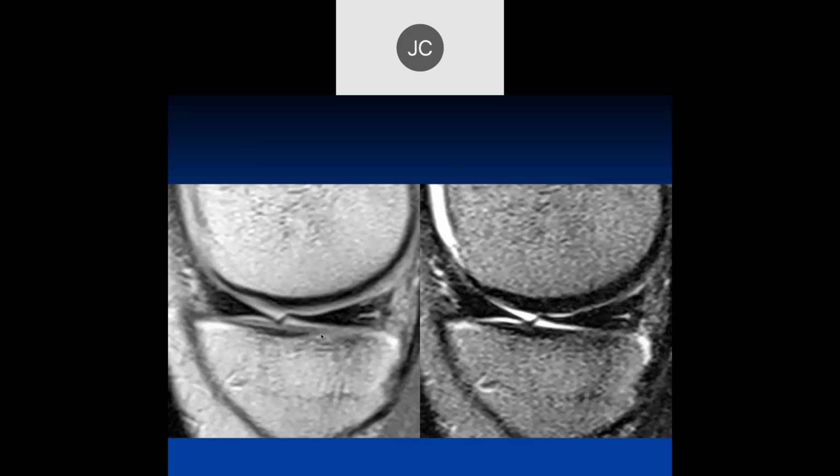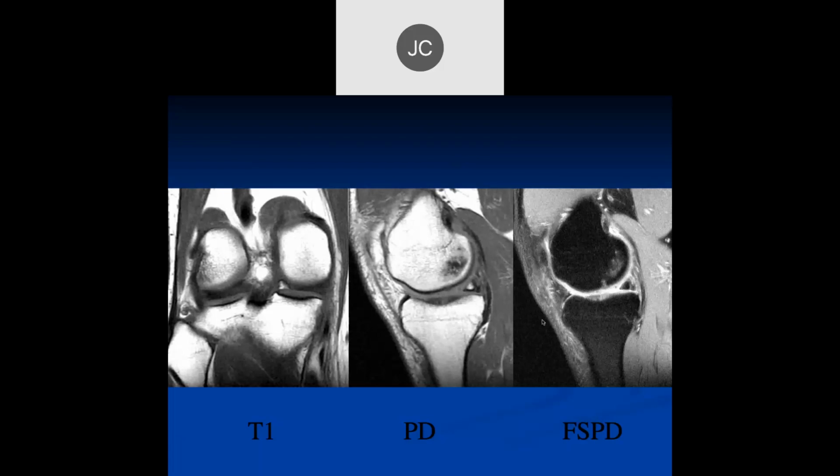On the sagittal views, we see in the center this wavy appearance of the meniscus. I think that's a flounce. Okay, so it's waving at you. Yes. And you notice there's a little bit of distension of the joint space here, so the meniscus is really not under pressure at this point. So it's just folding on itself. That's really a normal finding. Good.